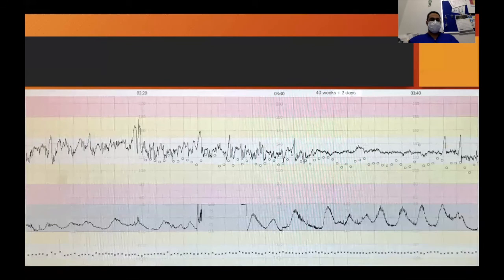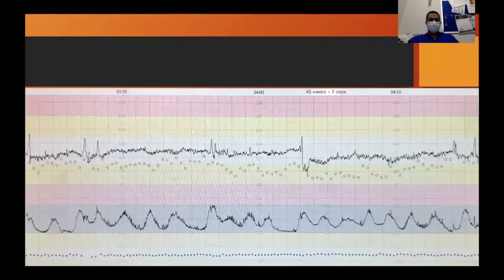Okay, so we're carrying on for another 1 hour. Anyone want to make another assessment? It looks like the baseline rate was creeping up, as in this area. Yeah, it took 130. Okay, what about here? Then it drops. Then it drops again.